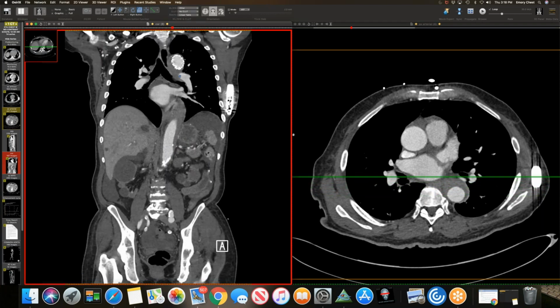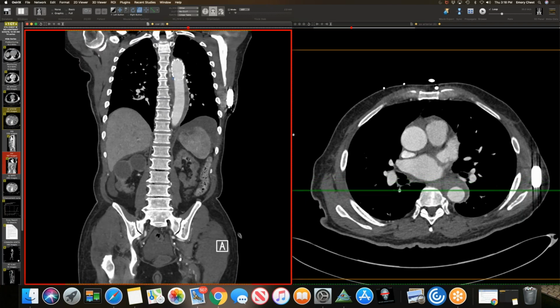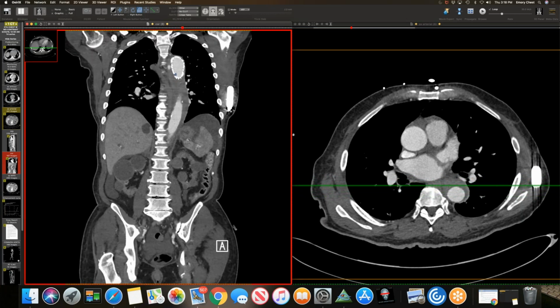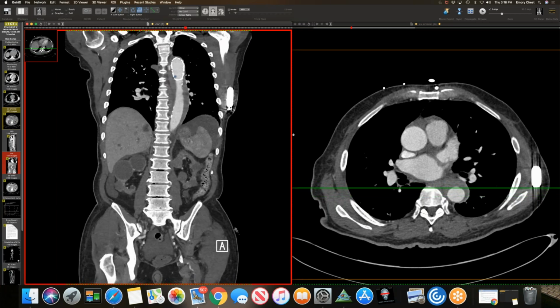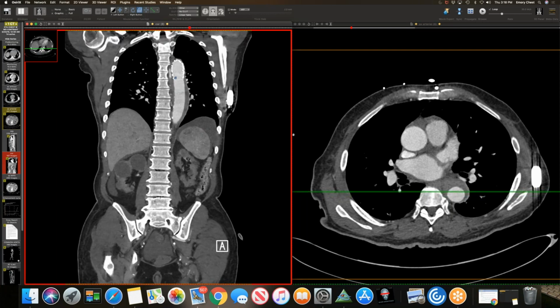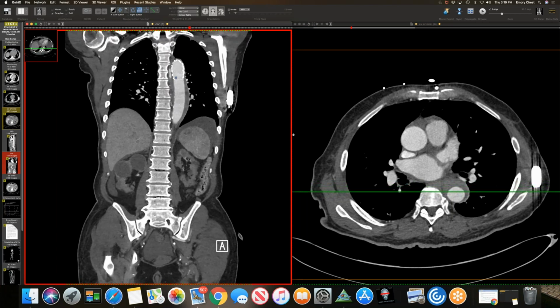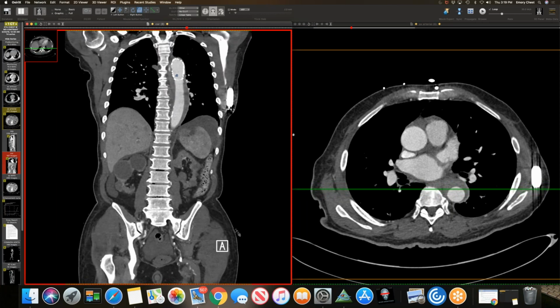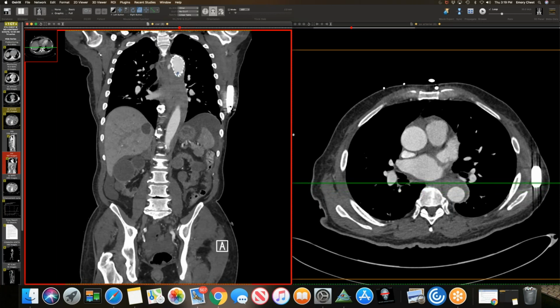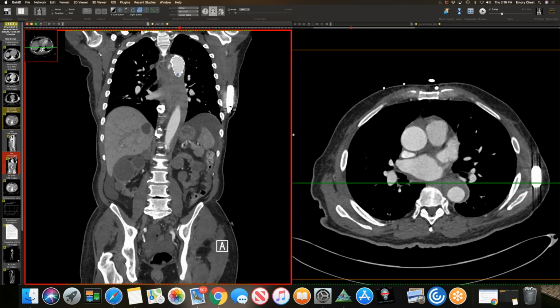So I told them I thought this was basically the repaired intramural hematoma, and the contrast that you can see outside of the confines of the graft is actually intramural blood pool, also known as branch artery pseudoaneurysms, which don't require further intervention and aren't necessarily associated with increased risk for progression to dissection or intramural hematoma. And then they were quite skeptical with me, but I was able to convince them.